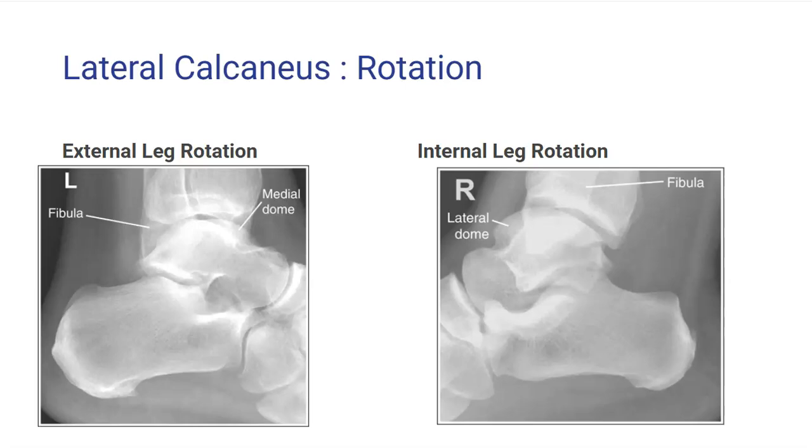And in this case, the anterior distal fibula will also appear anterior to the mid-tibia. Maintaining proper positioning and alignment helps prevent this rotational distortion, overall improving your image quality.